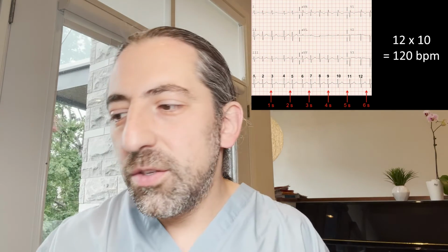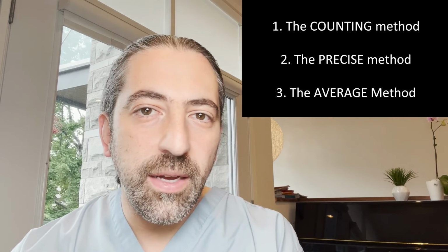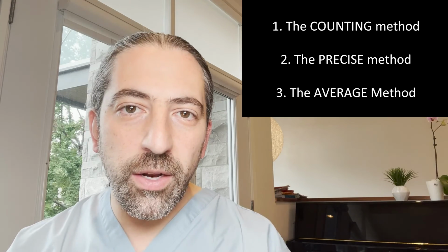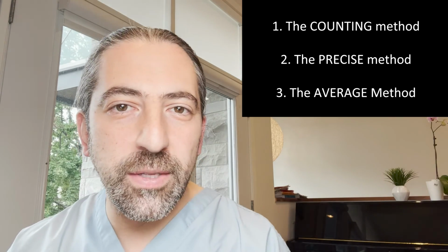So we can use this method to average out the heart rate over 6 seconds and use that to get the heart rate over a minute. So 12 QRS complexes over 6 seconds will give you approximately 120 beats per minute. All these methods are very applicable. In the case of a regular heart rate, I would use the counting method. In the case of an irregular heart rate, I would use the average method. And if you need the exact number, you can use the precise method.